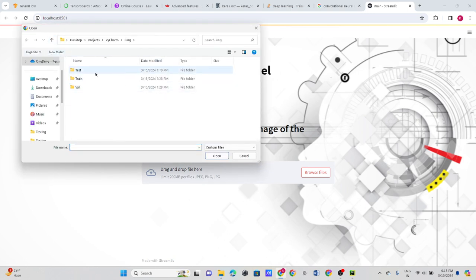Okay, this is the data set for lung cancer. Training set and testing set are different. Let us test for training set, because I have made this model using the training set, these three training sets, and I have divided these images using a pre-processing technique. Now let us check for testing set.